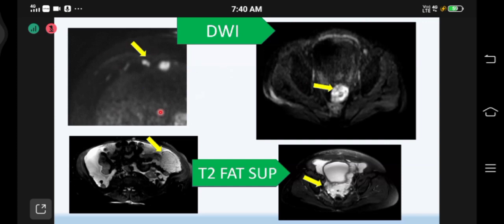What you need to know about is the diffusion. This is diffusion weighted imaging. You can see that the entire background, which is not highly cellular and does not show any restriction in diffusion, gets completely suppressed. The structures which show, like the nodular lesions here in the anterior perihepatic space, get highlighted. Similarly, in this section you can see a deposit in the pouch of Douglas, nicely seen, right? Plus a small nodule here. All these areas light up in diffusion weighted images.